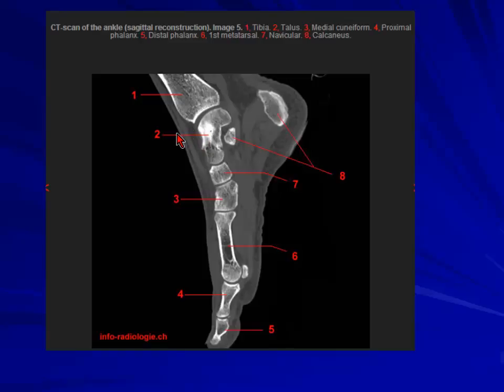On plain film, this gets elevated if there is a fracture. So that's why you see ancillary findings on plain film. If that is distorted, then that means there is something wrong. CT is good, you look at it, you see whether the cortex is intact, there is no fracture. But if there is swelling of this, loss of this grayness, and it becomes similar to this, then you say there is something wrong, there is possibly inflammation in the joint.